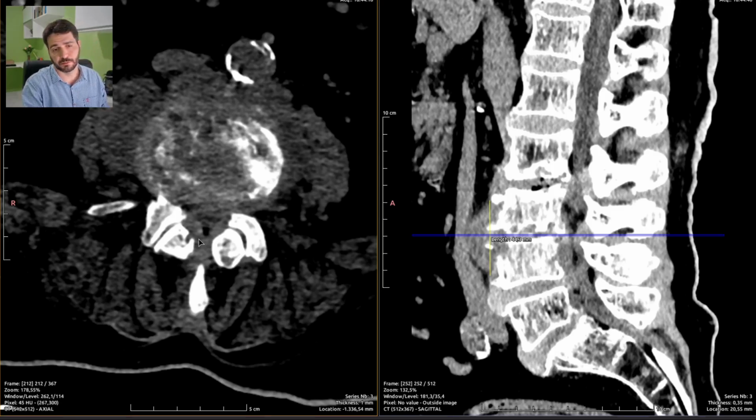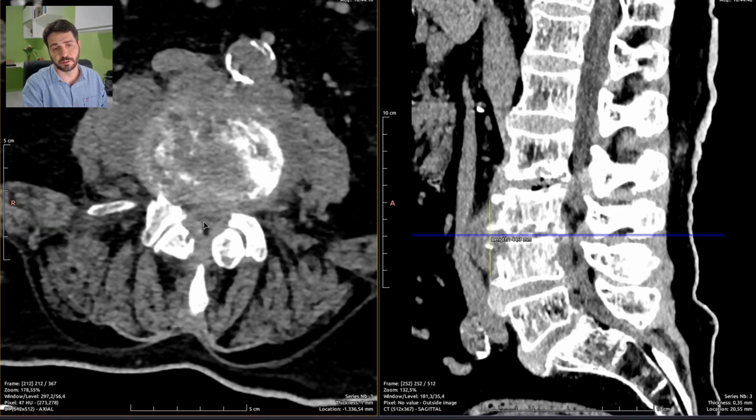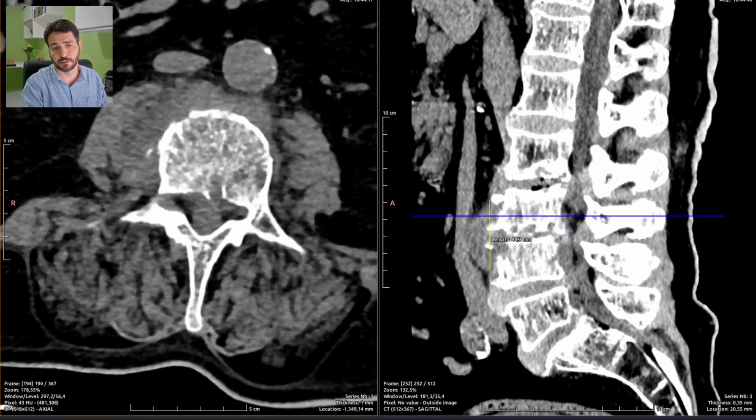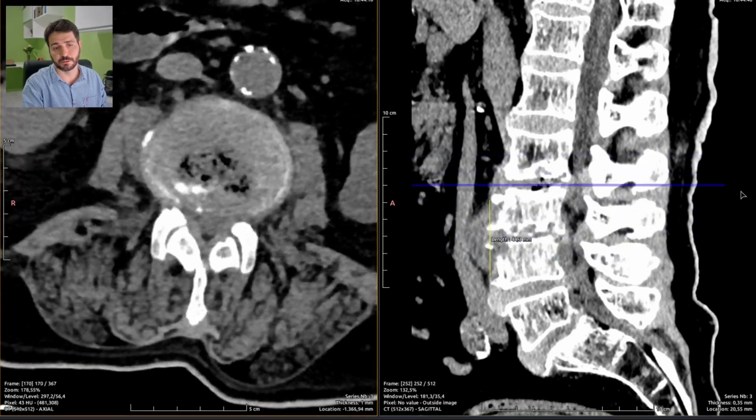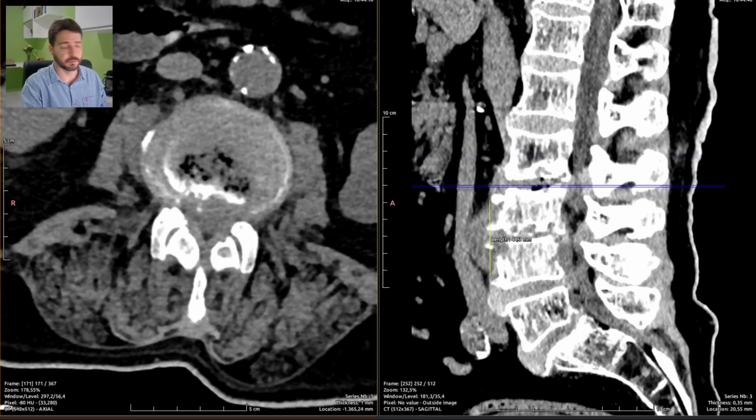Oh, there is also thickening of the yellow ligaments, as you guys see here. This is quite normal, and this is a factor that causes stenosis of the vertebral canal, of course. It occupies partially the canal. So, let's copy and paste the stenosis signs and descriptions to make it easier.